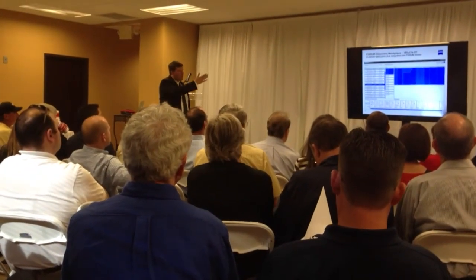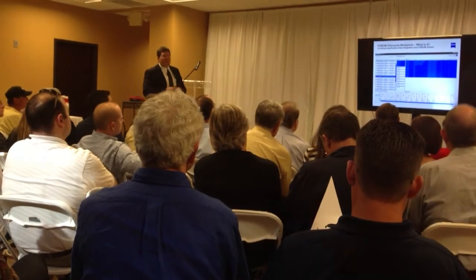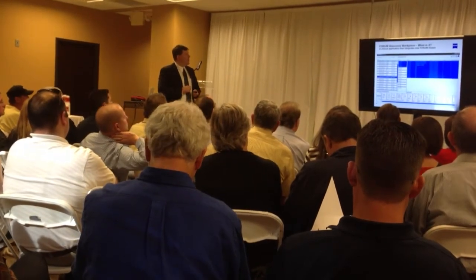Also, as you can see, we can look at multiple exams in different ways. We can click on each one of those on the bottom screen there to look at them in very detailed fashion. This is the patient reports, which allows you to look at this data very specifically.